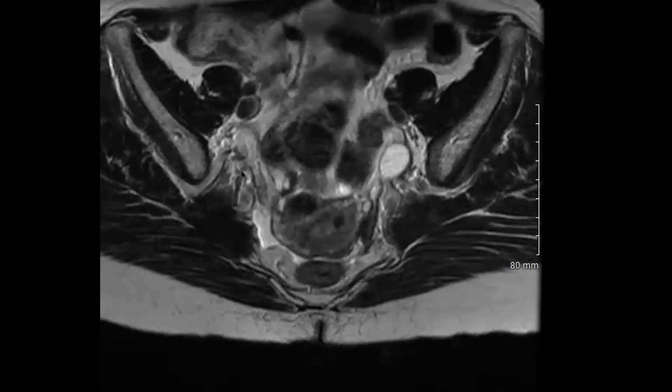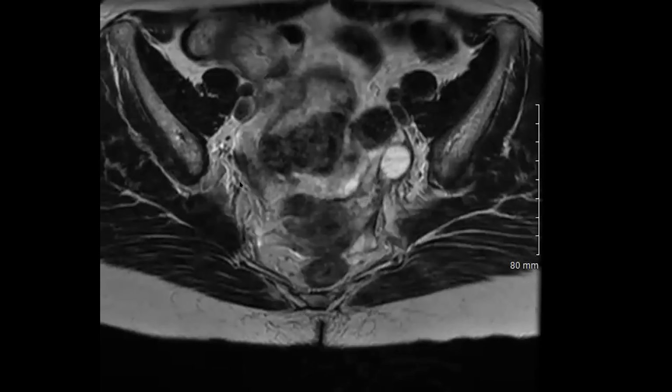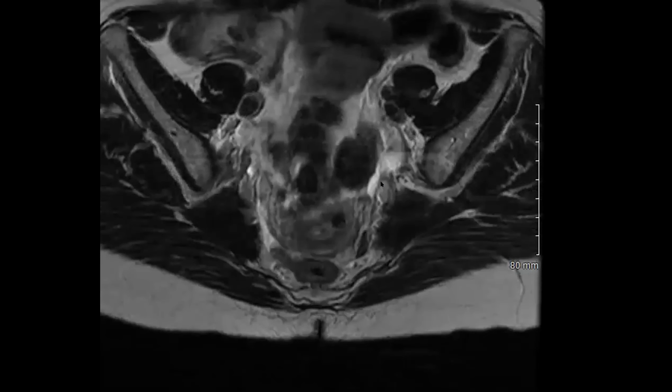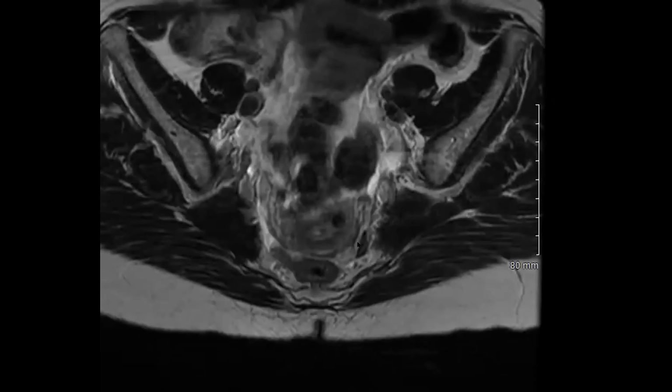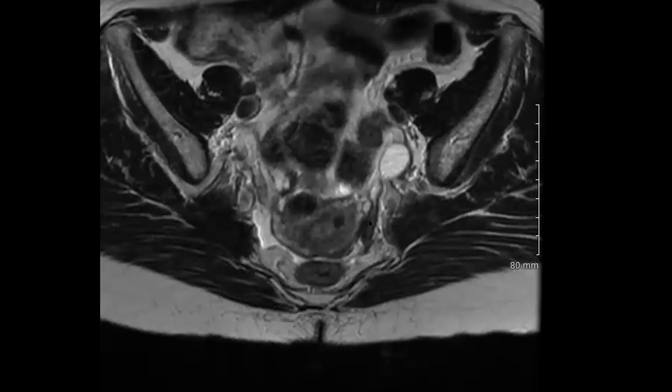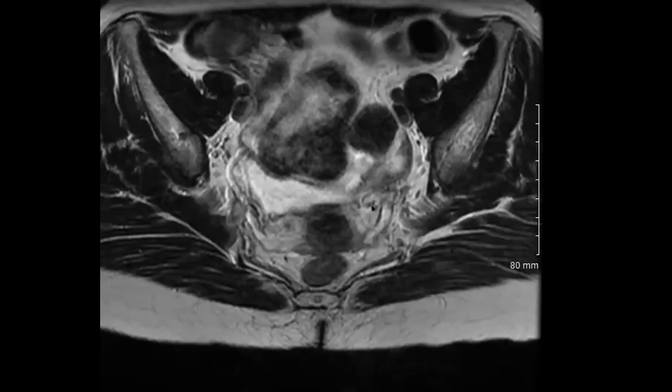Yeah. So I would raise DIE as well, in addition to, I agree with the endosalpingiosis, but I think there's architectural distortion here. Right. And burnt out endometriosis possibly because of the age group. And then here, that's all thickened and there's distortion. So I guess I would also raise DIE. That's a very good point you bring up.